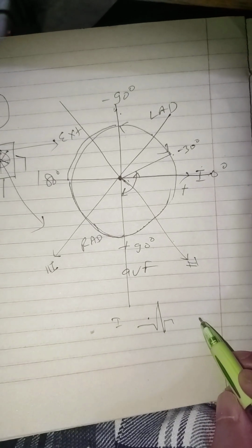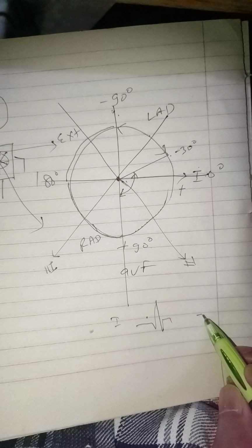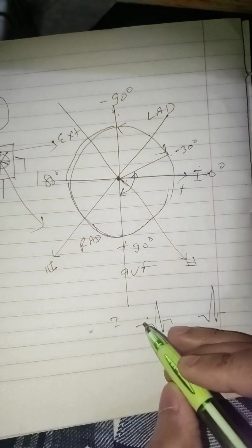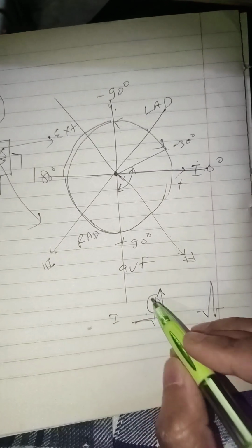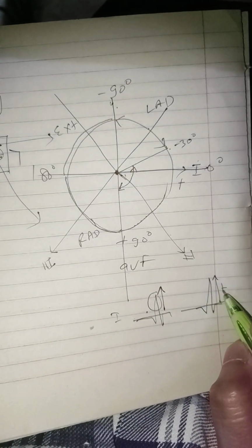And in lead AVF also you saw a predominant positive direction. Here predominant means, if this is the baseline, the majority of the amplitude is positive, right?